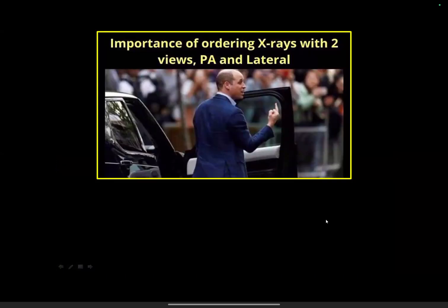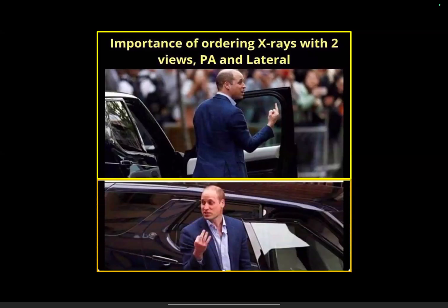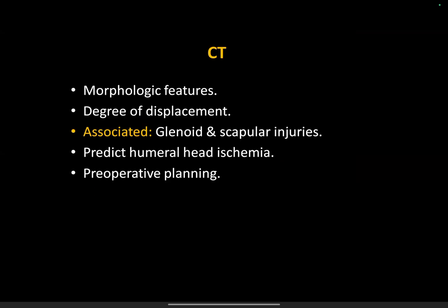Okay. The rule of two in radiology: never ever make your diagnosis based on one view, because it could be quite deceiving. All right. So two views and above, otherwise you cannot make the diagnosis. All right, let's talk about other methods of imaging, which is the CT.